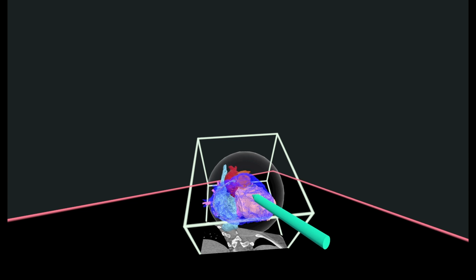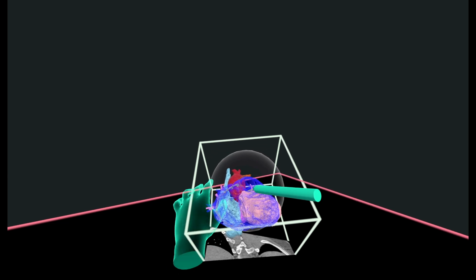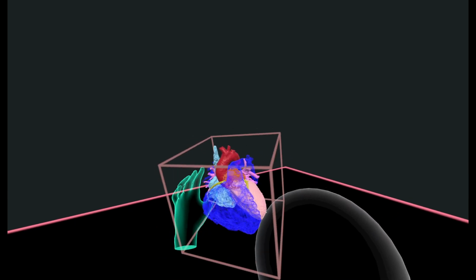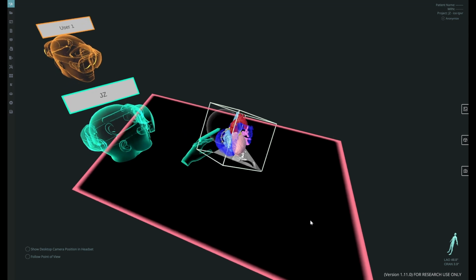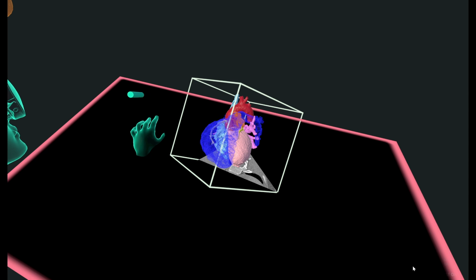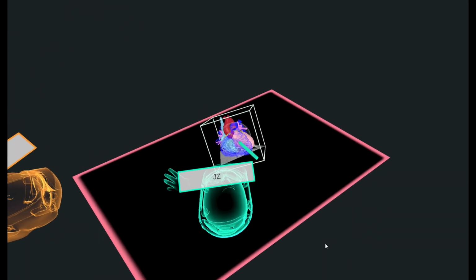So we can see the images from the ICE that we performed, and we can overlay it over the structures. And we can have a dynamic CT, which in this case is not a dynamic CT, but we can have this dynamic echo where we can have the segmentation of the echo. Now, this structure is automatically rendered with a volumetric render with an option called echo. And we can change the characteristics of that as we do on the machines, so we can actually change the contrast or do the 3D reconstruction, but a little bit quicker using the same tools on the volumetric.